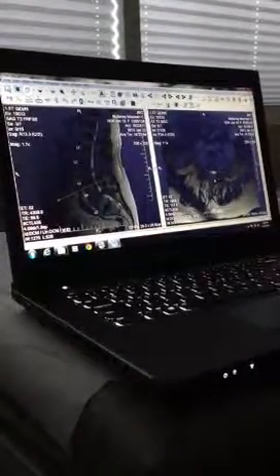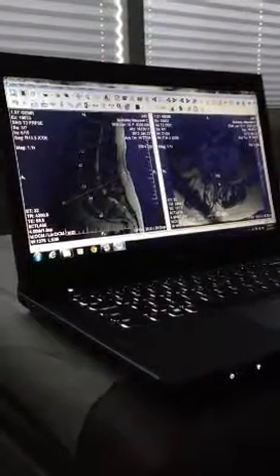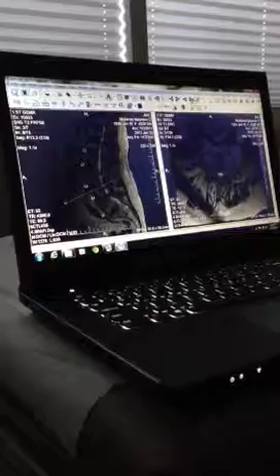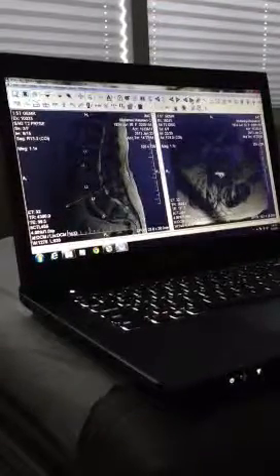It's going to be redundant because the problem is not very different as we're marching down the spine from L2 down to here. But we're going to go ahead and go through each of these levels. And if you have any questions, you don't understand what I'm saying, I want you to stop me and I want to review it with you. Okay?